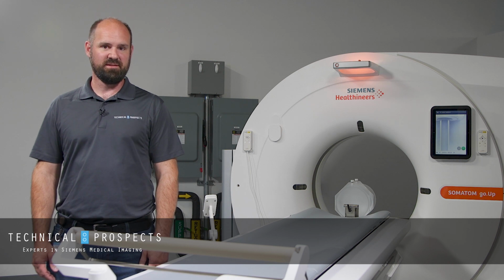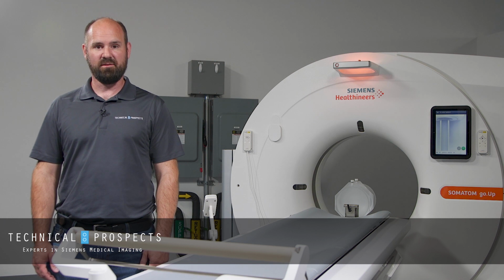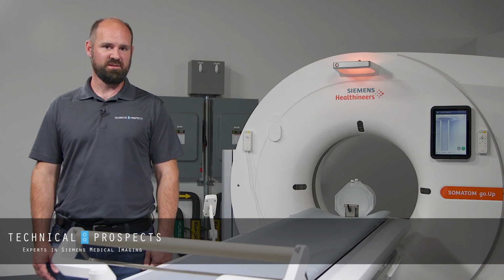In this video series, we're going to discuss the new Syngo Go on Syngo Native, and today we're going to learn where your local service page is stored and how to find your event messages in the new message viewer.